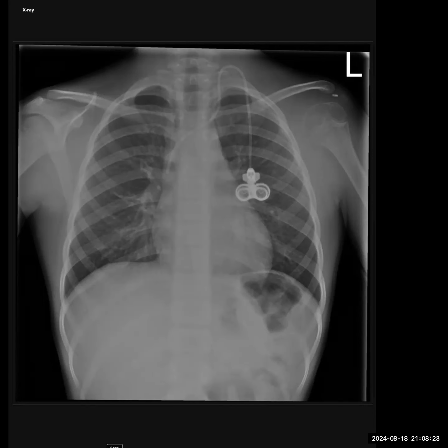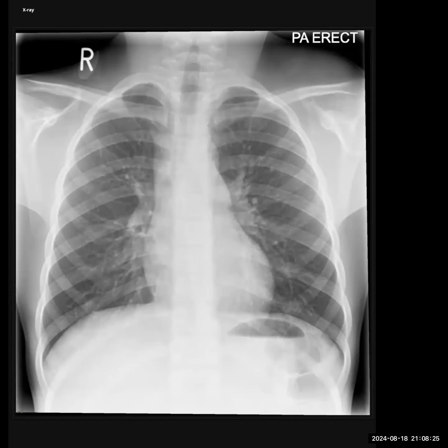You asked for the previous image, here you go. And you were right. This is a pre-operative image. So I'm looking at the left scapula again. I can see that there is a gross soft tissue abnormality, with a large lesion at the superior end of the spine of the scapula with internal areas of sclerosis, and soft tissue swelling overlying it, and there is also destruction of the underlying scapula.